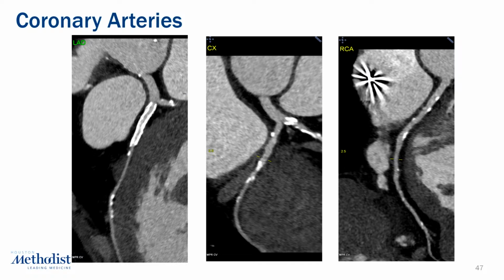But this is a patient that I read just recently. Really not a lot of calcification. You see the left main looks good. There's a stent in the LAD. Clearly looks good, right? Like you can see it's patent. Circ, some calcification, but nothing really looks obstructive. And the RCA looks okay too. So it's important to look at every phase.